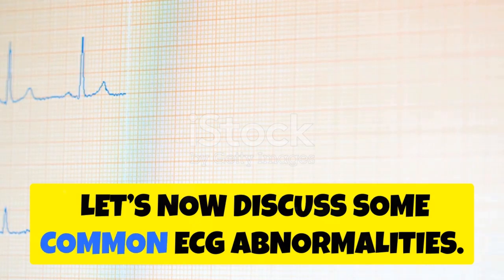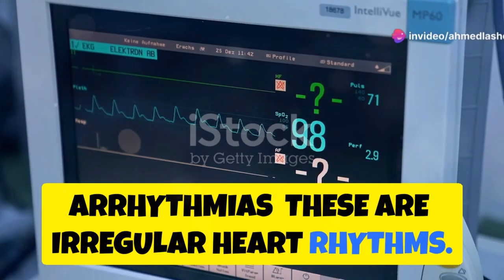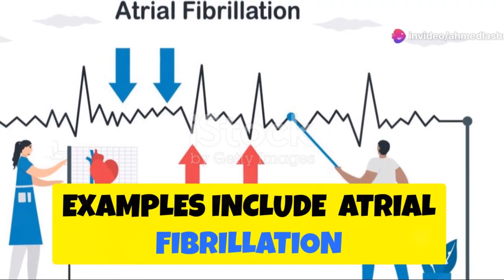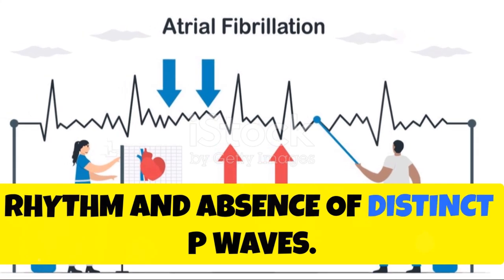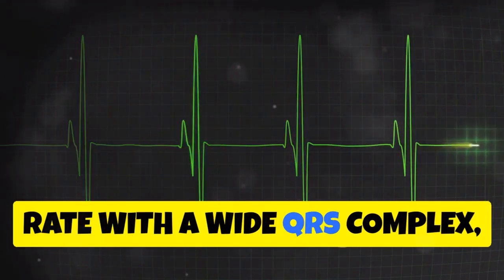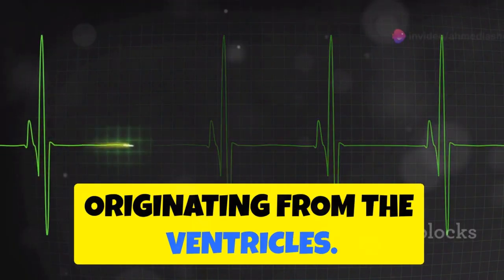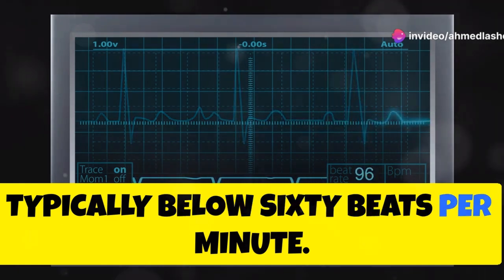Let's now discuss some common ECG abnormalities. Arrhythmias. These are irregular heart rhythms. Examples include atrial fibrillation, characterized by an irregular rhythm and absence of distinct P waves. Ventricular tachycardia, a rapid heart rate with a wide QRS complex originating from the ventricles. Bradycardia, an abnormally slow heart rate, typically below 60 beats per minute.